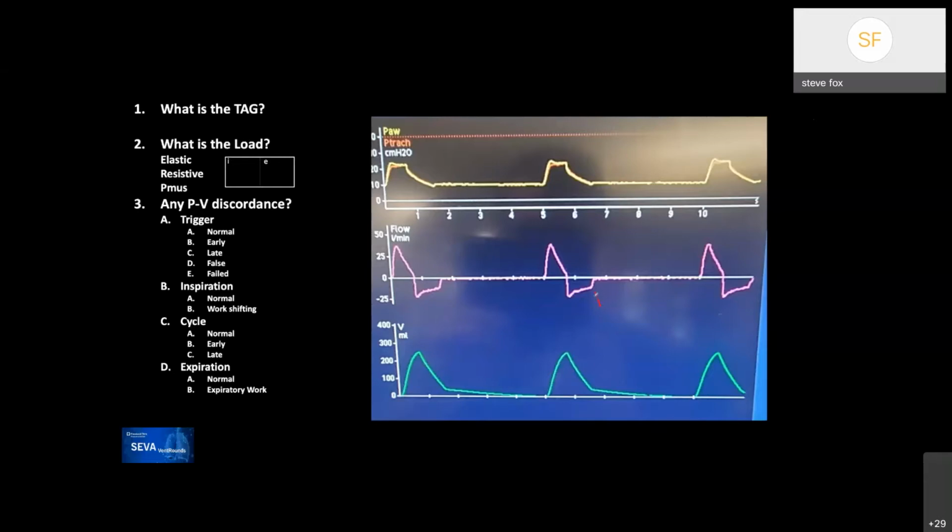So it's almost as if something is limiting the expiratory flow. It's as if there is expiratory flow for a while, and then all of a sudden the expiratory flow stops or slows down. That's also reflected on the volume waveform, where it goes down steeply and then all of a sudden goes down not steeply. So anyway, this is the part that is stumping me here.